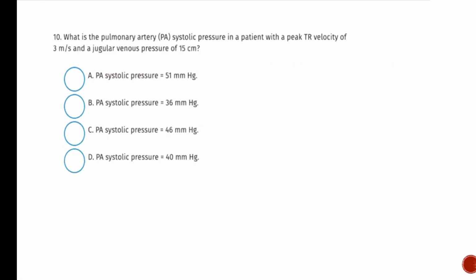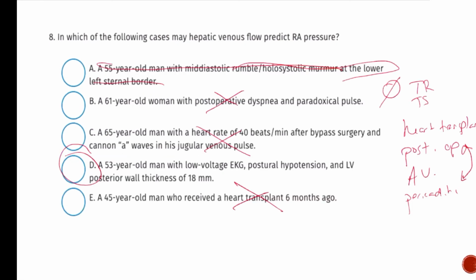But why low voltage EKG? In what way? Like, could this guy have pericarditis? Or pericardial effusion. Yeah, but we don't see any changes here with that, right? So I have a posterior wall thickness, but that's not telling me that the pericardium's inflamed, right? It's showing that someone has probably some obesity and LV hypertrophy.